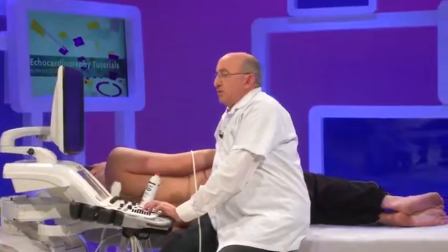As you know, echocardiography plays a very important role in the assessment of infective endocarditis. But when we are thinking of infective endocarditis and echocardiography, we think first of transesophageal echocardiography. However, what I will try to show you today is that the first examination in suspected infective endocarditis must be transthoracic echocardiography, and that we can obtain several very useful pieces of information only with transthoracic echo.